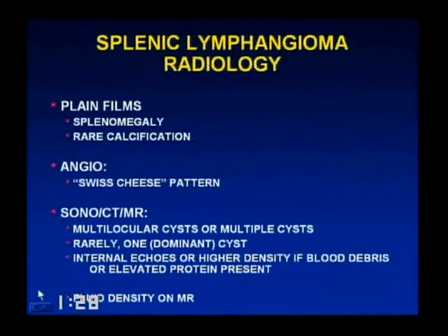And I want to just finish up by talking about the last two entities, which is splenic lymphoma and metastatic disease, and a few quasi-unknowns. Okay, that's the lymphangioma.